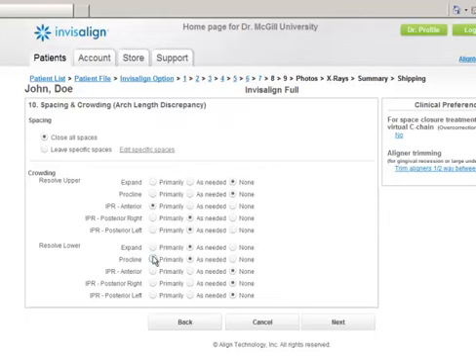And on the lower, I could maybe procline a little bit, but I may be able to expand, and I don't want to do any IPR in the anteriors, and just for the sake of it, I don't think it would be very wise, so no IPR. Okay, next.